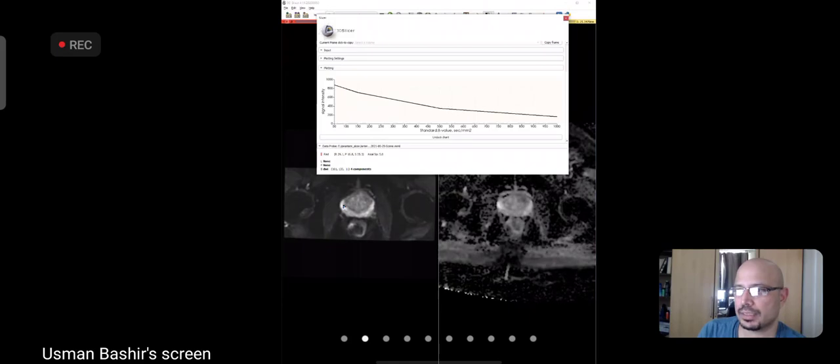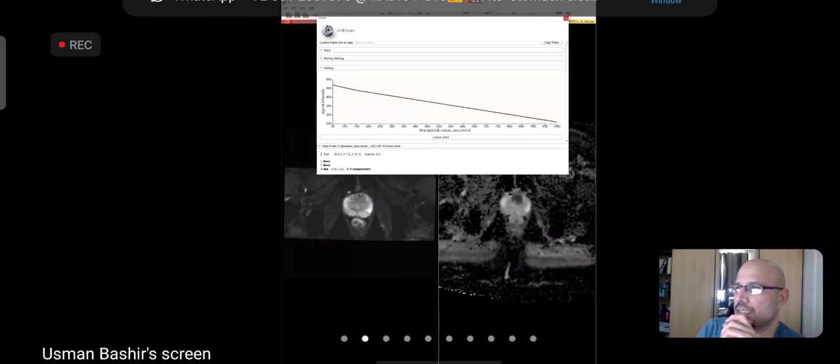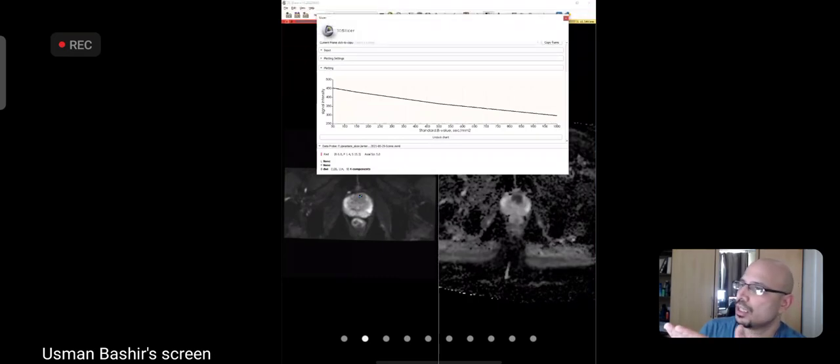अब हम lesion की तरफ आए. अब इसका slope देखना है. Actually, you see that? I hope you can see already कि यार signal intensity 450 है पहले image की और आखिरी image की 300. तो slope इसका बड़ा shallow है. So actually, it's that difference between low B value and the high B value that determines the intensity of the ADC map. Because the slope is so flat, you have a very low ADC map. Or in the benign pair, slope is steep.